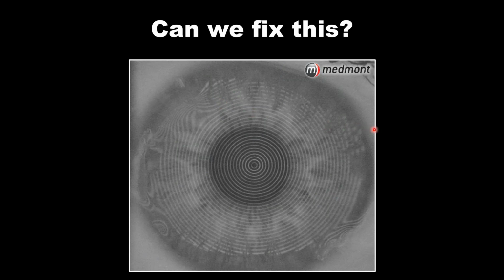The patient just left and drove 2 hours back home, and they're waiting for us to design their custom lens. That's going to take days for it to arrive from the lab, and we might find out the lens isn't going to work. So this isn't an optimal scenario. Can we edit this information to ensure that we create the right first lens?